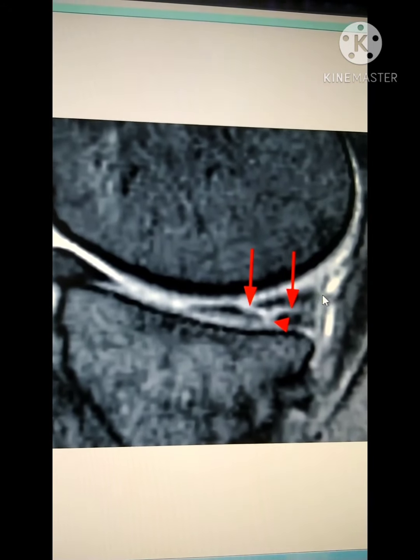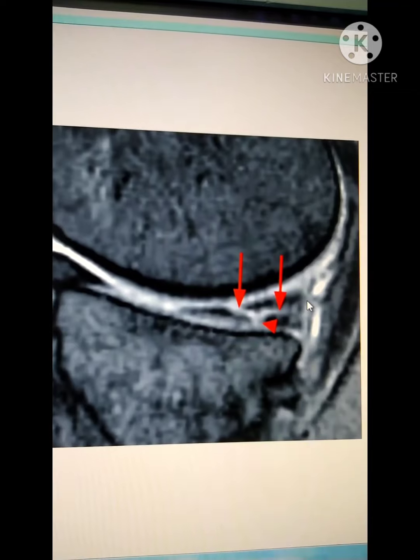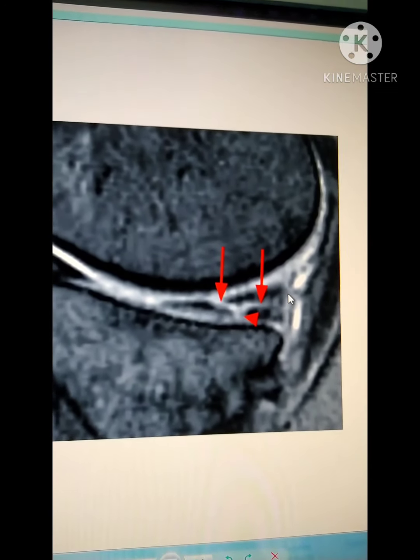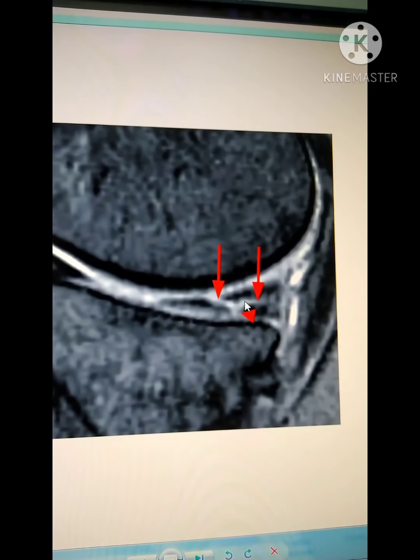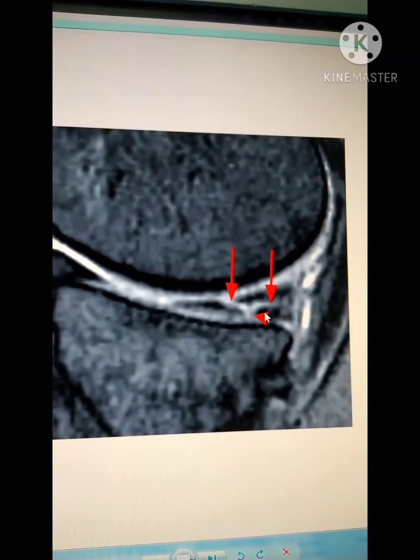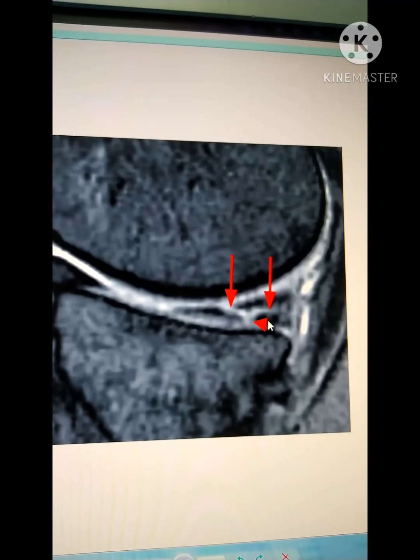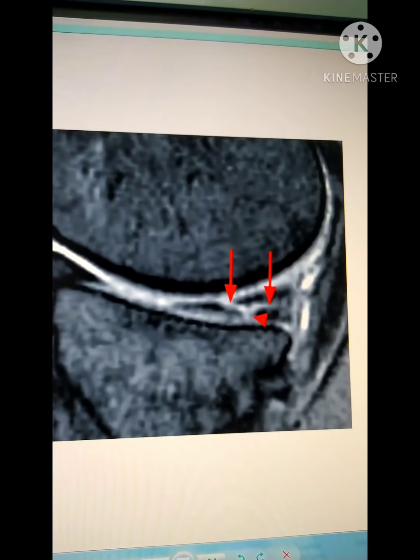1, 2, 3. It normally happens whenever there is some degenerative change. You can see a lot of tears here, a lot of small triangles within the meniscus. So it's called a complex tear. You cannot repair it because it's already broken down. Either you have to remove it or you just keep it there. It normally happens with the degenerative mucoid meniscus and all degenerative things.